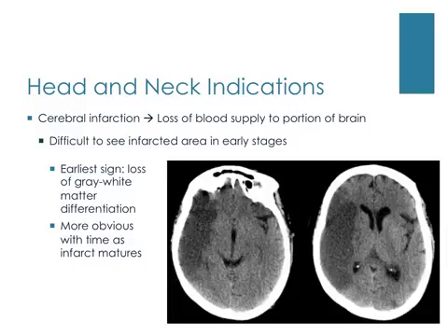And in these pictures here, you can actually see the loss of gray-white matter differentiation in both of these pictures. This is evidence of a stroke.